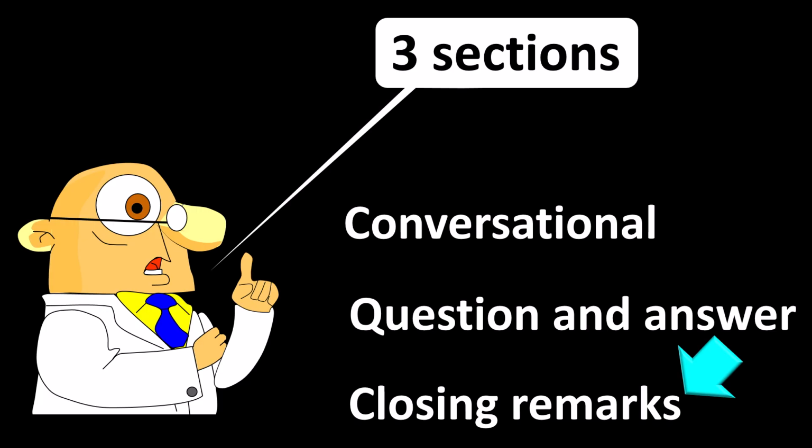In general, my approach to reading EEG is to formulate a tentative conclusion after reviewing a few epochs of an EEG. Then, as I look at each new epoch, I ask myself if what I am seeing makes me consider changing my previously arrived tentative conclusion. If the answer is no, then I go to the next epoch. If the answer is yes, then I stop and analyze the epoch by going through the same process I initially used to arrive at a tentative conclusion in the first place.